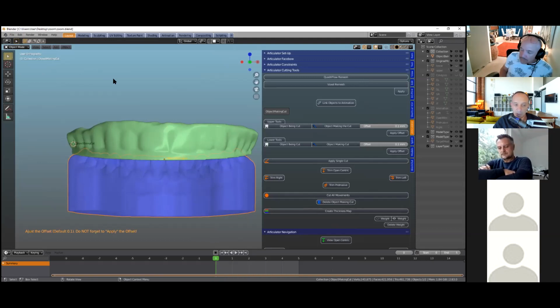And likewise, we do the same now with the splint. So we're transferring the same technique onto the splint module. Even if, hypothetically speaking, you made a mouth guard and you want the lower jaw to bite into the upper mouth guard, if you've got surface to surface, it may not engage nicely. But if we've got a little offset there, the lower model would then engage nicely in occlusion onto the mouth guard, wouldn't it, Wolfgang? Yeah, that's right.